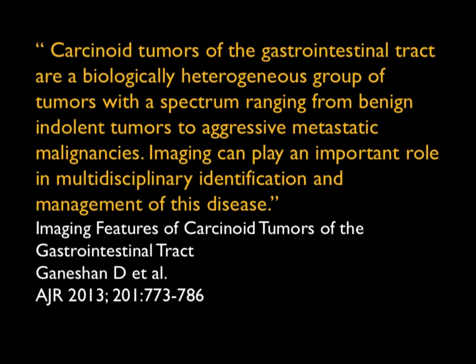Carcinoid tumors are really interesting because we are seeing them a lot. They're a heterogeneous group of tumors with a spectrum ranging from benign indolent tumors to aggressive tumors with metastasis. Imaging is very important. We sometimes will pick them up incidentally, and other times because the patients have symptoms.